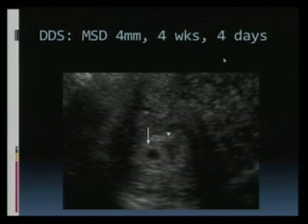If you see this sign, don't get mad at the technologists if they don't show you one ovary. They say we couldn't see it. Right now, our signs are very confirmatory towards an intrauterine gestational sac. Fair enough? So far, everybody is with me?